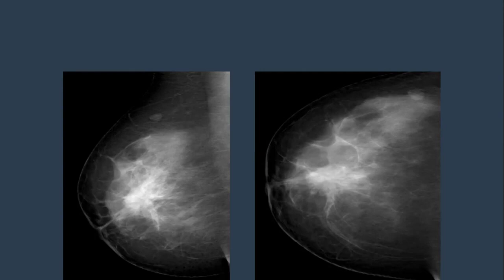At the same area of distortion, is the density the same as the rest of the breast? No, it has increased high density. Most likely, I will do a spot compression view before, to see how it is. You can call this high density. Is it focal or diffuse?